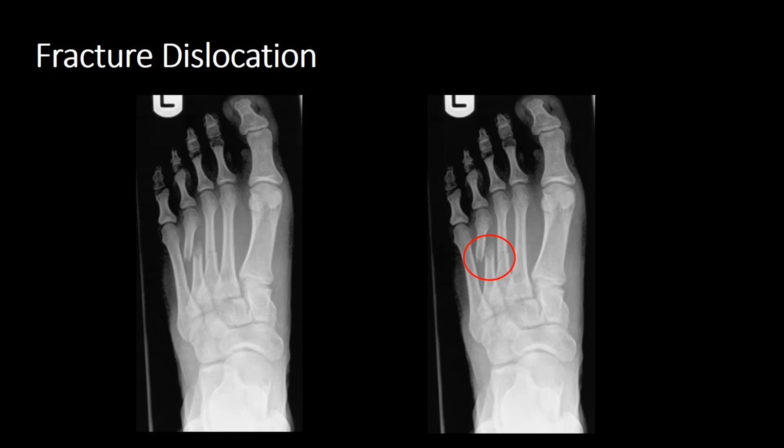This is quite an impressive x-ray. We can see two quite distinctive fractures of the third and fourth metatarsal. Now our third metatarsal is minimally displaced. You've only got the tiniest step in the cortex medially, whereas our fourth metatarsal, there's marked lateral displacement and overlap.